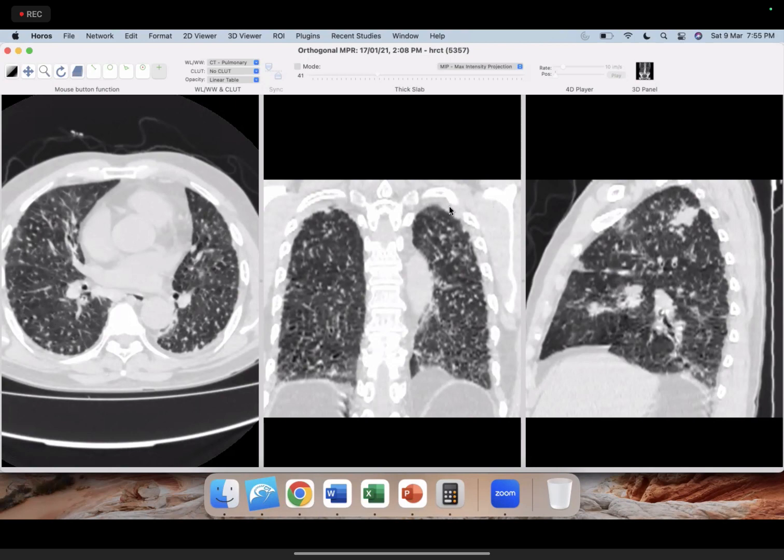Experience with COVID-related ILD. So nothing now, but COVID-19 lung sequelae are of course present, and those patients typically show either some degree of improvement or they are unchanged, but none of them are worsening. So anytime you see COVID-related ILD, always ask for the previous scan because that will help you confirm. Otherwise, you might make a mistake to call any new ILD, and none of them show progression. So if you have a progression, then think that this is not a COVID sequel. It is likely an underlying background ILD.